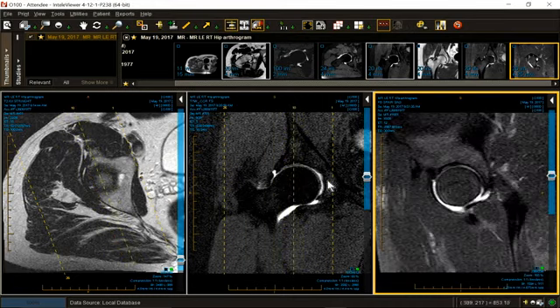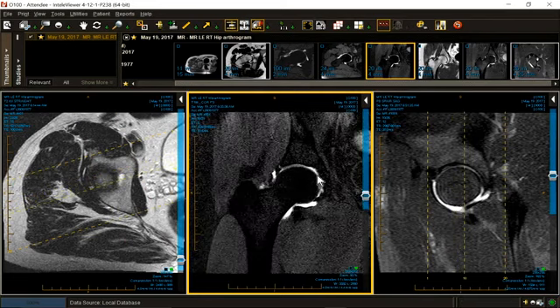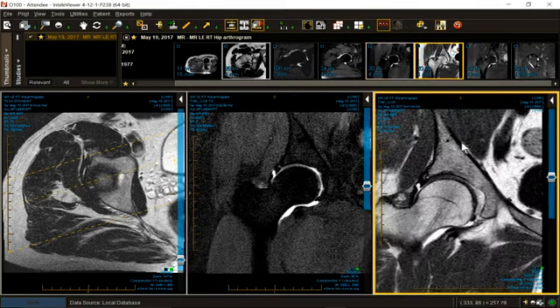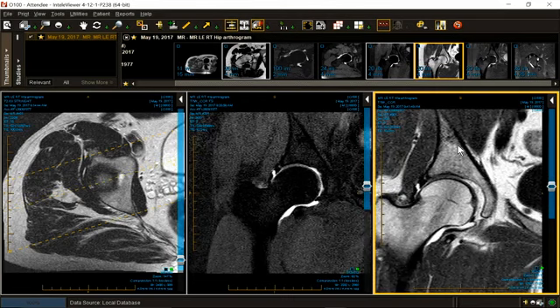Number 2, generalized arthrosis with hyaline cartilage loss, moderate in severity, without bone penetration. Let's look at another. Probably leave the ligamentum teres insufficiency in the body.